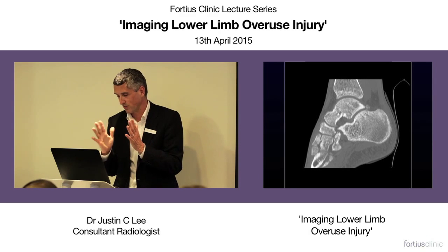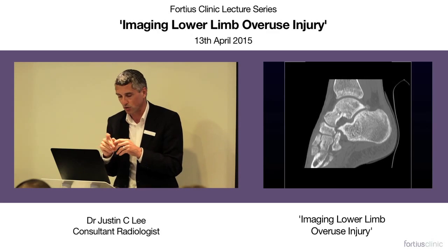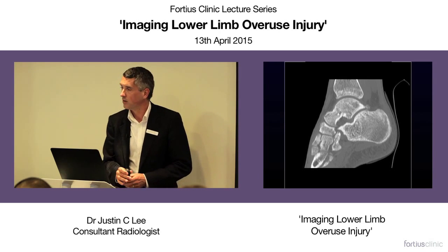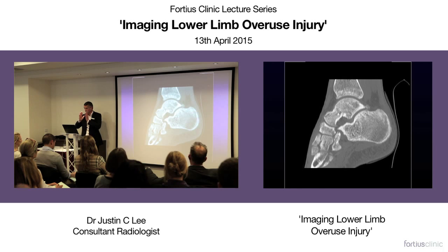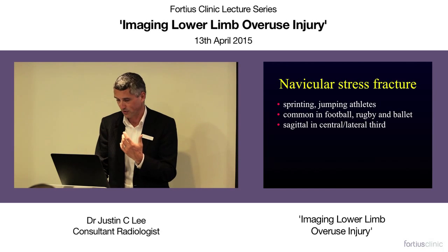I'm sure it's to do with the different tractional forces going through the bone, but it's interesting because people can look at that and go, well, that's healing, so it's a healing stress fracture. The problem with saying that is that it's not correct. What's happening is the bone has lost its integrity and it's crunched down, so you've got denser bone than you should have. I'm talking about navicular stress fracture specifically now because this is a common fracture that we see, and it's a common problem, I think, for the surgeons.